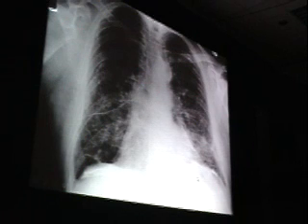If you only see calcification on the hemidiaphragms and the pericardium, what you can say is that this patient has been exposed to asbestos. To talk about asbestosis, legally, that really means that they have underlying lung disease. So you have to see definite evidence of underlying lung disease, which actually we do see here.